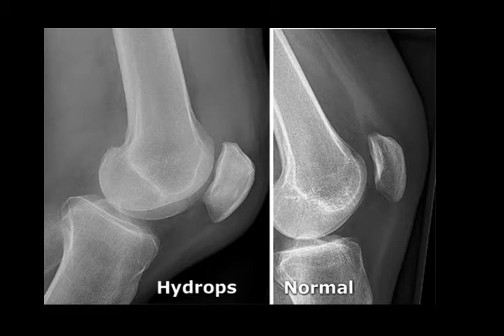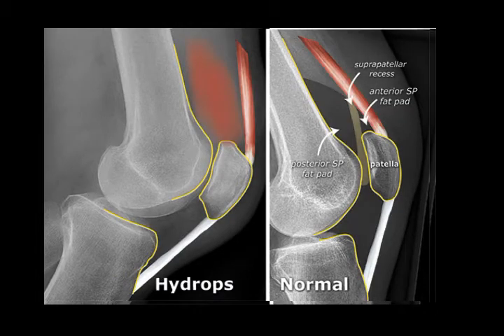Sometimes both lipohemarthrosis and hemarthrosis may not be there in knee radiographs, and there may be only serous fluid collection. In this case, there will be no three fluid layers and no dense collection within the suprapatellar pouch. Rather, there will be obliteration of the normal soft tissue planes that are seen in normal knee radiographs.